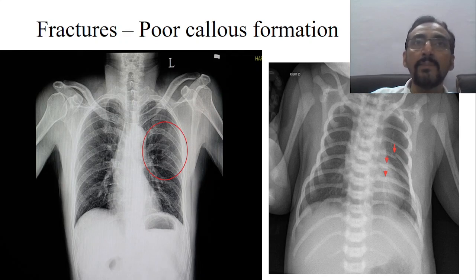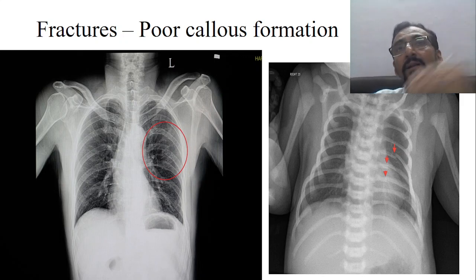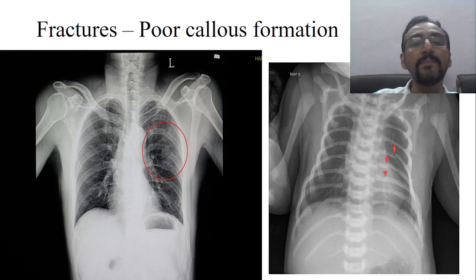इसलिए ABCD वाला जो हमारा फॉर्मेट है, A फॉर एयरवे एंड B फॉर ब्रोंकस, C फॉर लाइक दैट जो है कार्डिया, ठीक है, या सॉफ्ट टिश्यू बोन के जो ये जो पैटर्न है, इस पैटर्न से आप जाएंगे तो मिस नहीं होंगे. 1 by 1 पोजिशनिंग, रोटेशन, सॉफ्ट टिश्यू, बोन केज, ऐसे इसी पैटर्न में इसी क्रम में आपको देखते जाना है, तब आप मिस नहीं करेंगे. अदरवाइज यू कैन मिस द थिंग. सो दिस इज about the fractures.